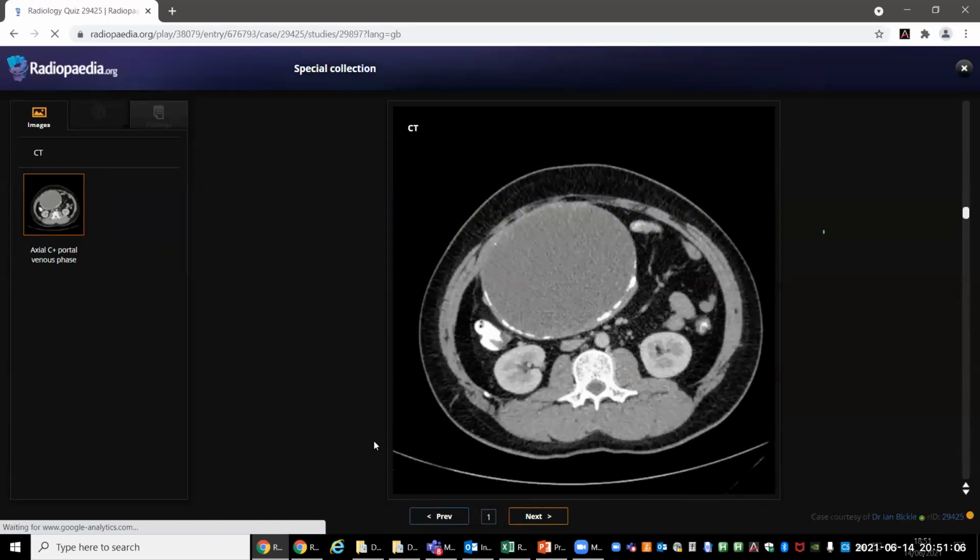And so the previous one, the X-ray is not the same patient with the CT. Understood. You did the X-ray very well, and you also did this very well. But I also expected you to actively look for any relation of this cyst with the pancreas, to be sure that it is not a pancreatic pseudocyst.